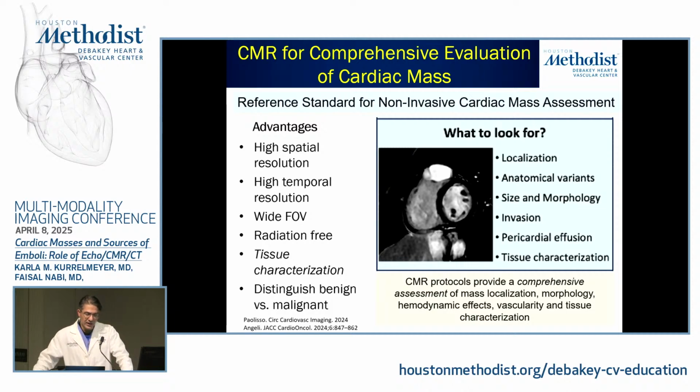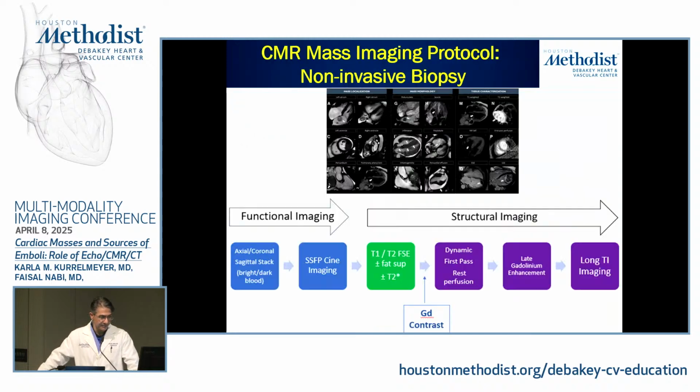This technique, I want you to think of it as a non-invasive biopsy. Not only can you localize the lesion in great detail, you can describe it, you can tell whether it's invading or not, whether there's any pericardial effusion associated with it, and tissue characterization. It's really a comprehensive assessment of your mass.